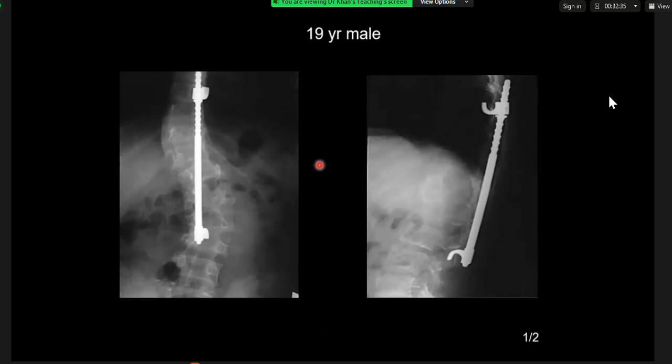On the lateral radiographs, we can see posterior vertebral body scalloping with enlargement of the neural canal, and likely secondary degenerative changes due to the abnormal alignment of the vertebral bodies.